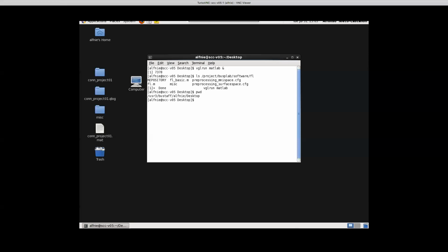Right. So if you go in reverse, you look at the individual cortex, and you're mapping different shapes of things that should still represent, say, the precentral gyrus to the precentral gyrus on the FS average brain surface.